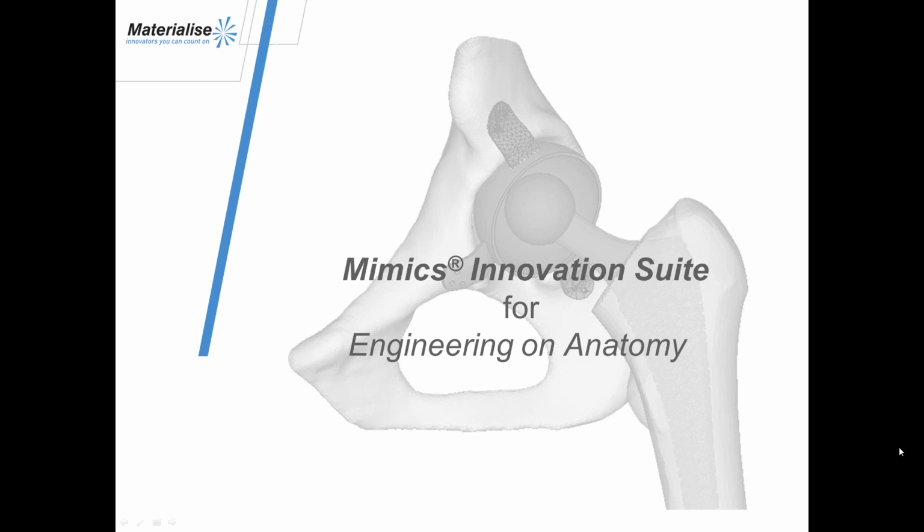The Mimics Innovation Suite can help you with your morphometric analysis. I'll be showing you some workflows within the software that will help you analyze 3D anatomical models.